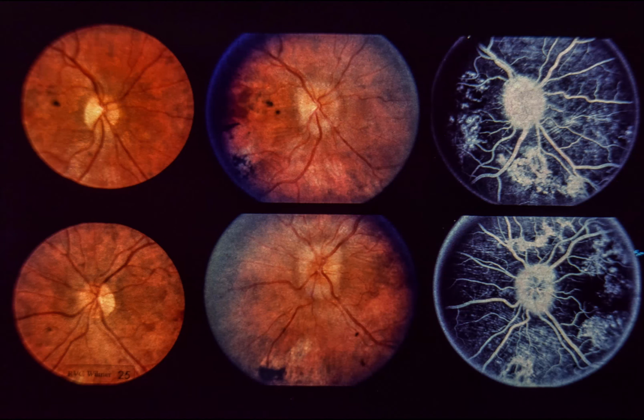Slide 25. Optic disc edema and APM-PPE. This 27-year-old male developed a high fever, swollen glands, and a stiff neck. At the same time, he noted blurred vision and photophobia in both eyes. Visual acuity was 20/30 bilaterally. Upper left and lower left. The optic discs are normal, but pigment epithelial changes are visible in the peripapillary regions of both eyes.